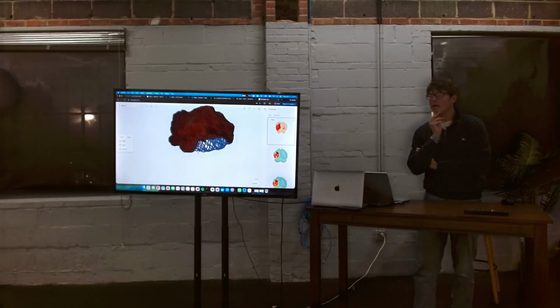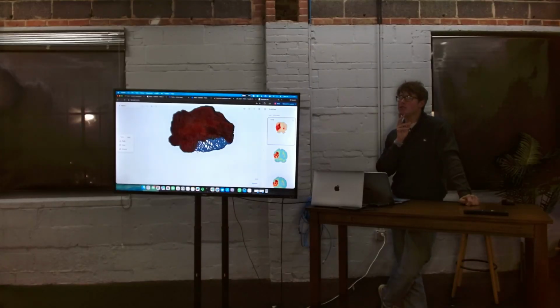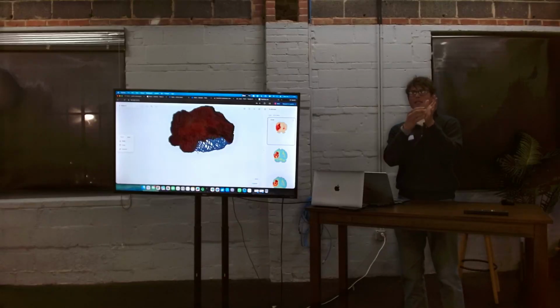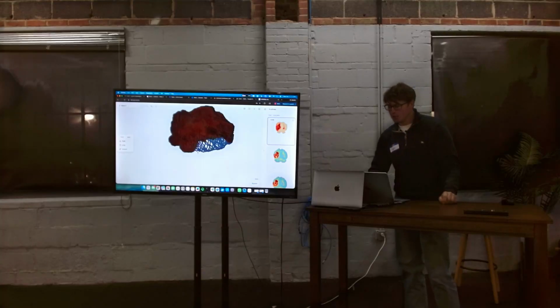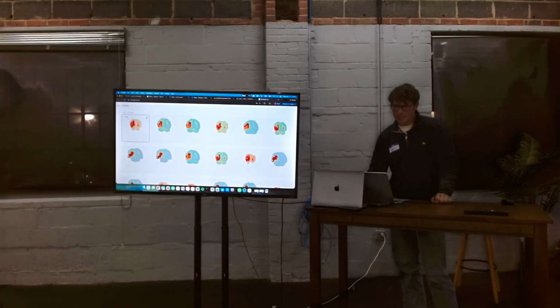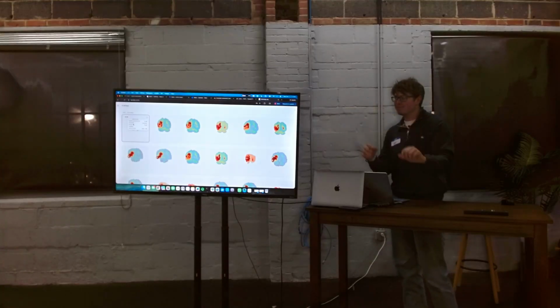So this is a React web app. So it's all JavaScript. And as far as how it's extracting it, it's using a library called DCM.js. It's just a way to, on the client side, parse all the different DICOMs and extract the images, and also important information like the position of the plane itself. So you'll see right here, it's extracting all of this image data, and then it's extracting a lot of different information about each of these planes, and then plotting it all in 3D space in a volumetric shader.